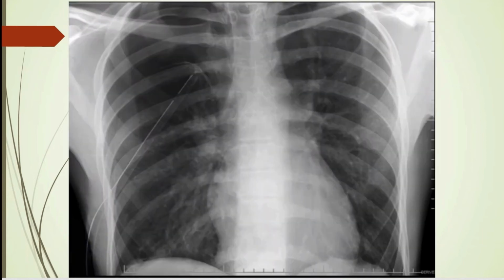And here is a really interesting chest X-ray. So parts of it are cut off, excuse me. We'll do A for airway here. You can see the trachea coming down. Looks like it bifurcates about there. That looks like Carina. And B for bones. So you can see the rib. That's a first rib up there. Here's second rib, third rib. They look all okay. Clavicles, part you can see. Looks all right. Don't see any fractures.